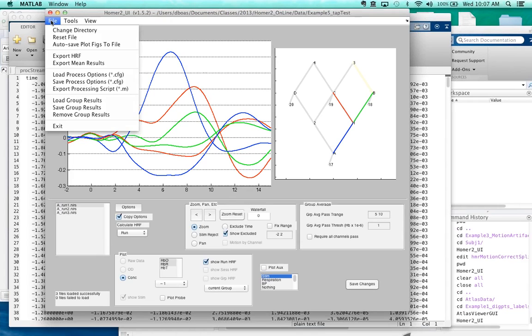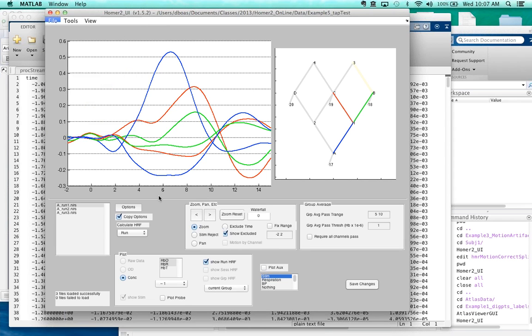There may be some historical stuff, I think maybe under the file menu. And to tell you the truth, I don't know how those work. I haven't looked at those, so I'm not prepared to talk about those. And those may not work actually well. So I'll make a note to look at that. But what I just showed you about right clicking on the trace, would that meet your needs?